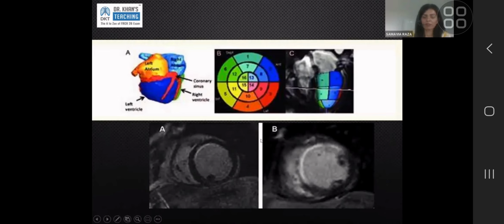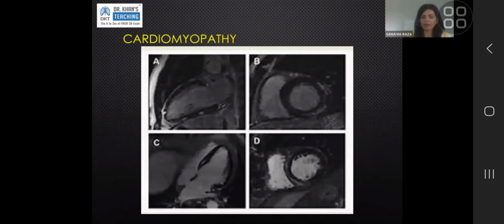This model is what you would keep in your mind to calculate the number of segments and label the segments accordingly. So that would be the anterior wall. That would be the inferior wall. So it's not anterior and posterior, it's the anterior wall, inferior wall, lateral wall, and septal wall. The anterior is not in relation to the body or the front of the body, it is anterior in that image, if that makes sense. The terminology is different.